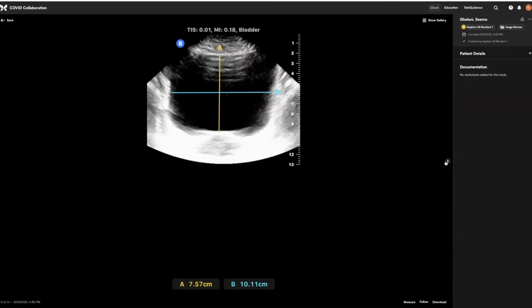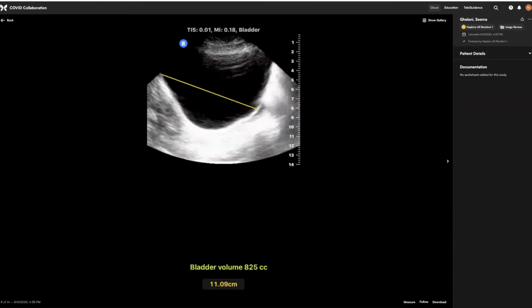The first would be that I don't know if everybody shares this view, but for me, the way to go into an ultrasound scan is to have an anchor image in your mind of what it should look like when you get the image you're trying to get. So instead of just kind of hunting around, you already have your mental image of what you're looking for, what an ideal image looks like. And I think this is a great study in that the bladder is really rectangular, almost square in the transverse image as you're showing here. And if you want to skip forward to the measured sagittal image, it's got more of a triangular shape. In this case, it's almost getting a little spherical because this person has 800 cc's in their bladder, so it's going to take on more of a sphere shape as it gets really big.